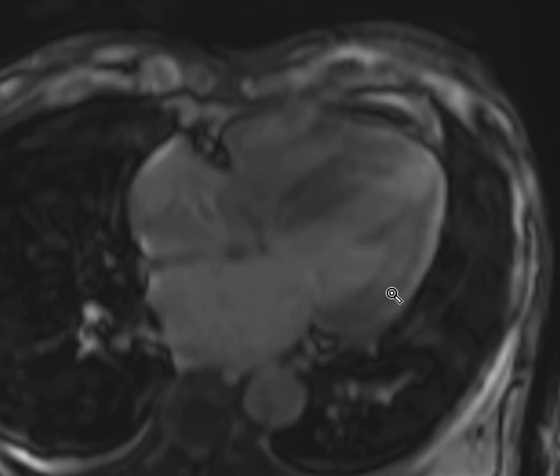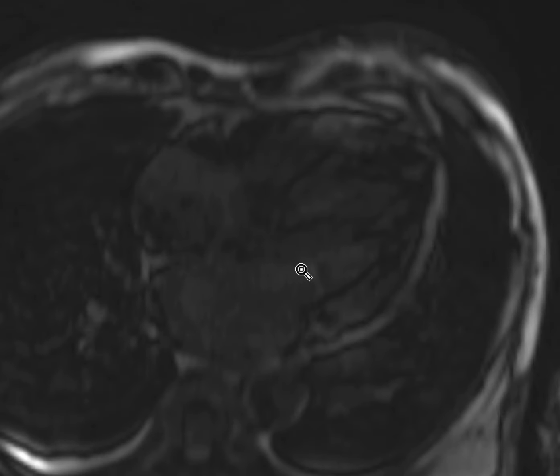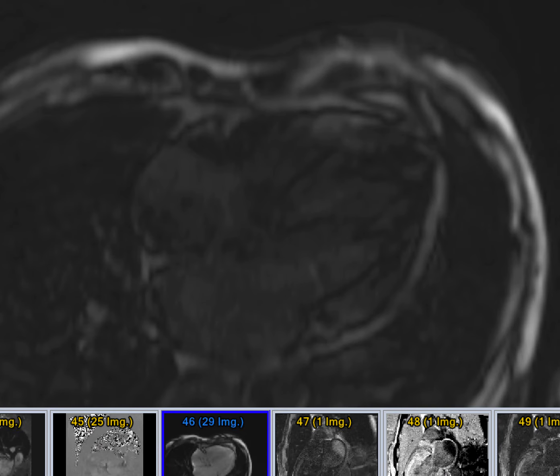Now let's try to focus on whether the blood will null before the myocardium, or is it the myocardium before the blood. This is the first image, second, third, and on the third image we could all see that the nulling point of the myocardium is before the blood. In the next slice you would see that the blood has now turned black. This is an abnormal kinetic, and this is very striking for the diagnosis of amyloid disease of the heart.